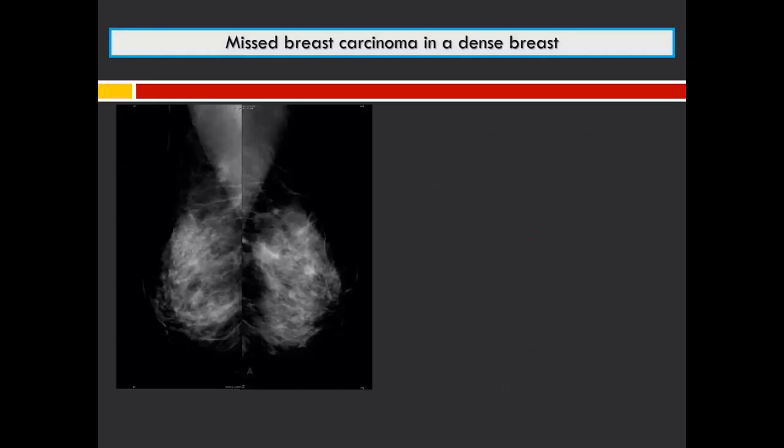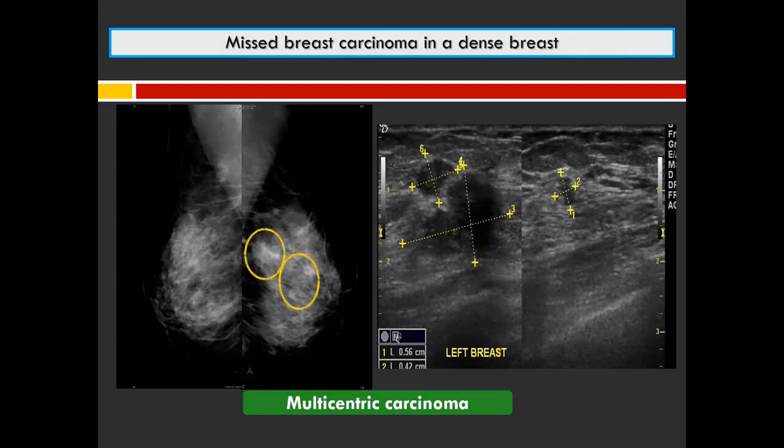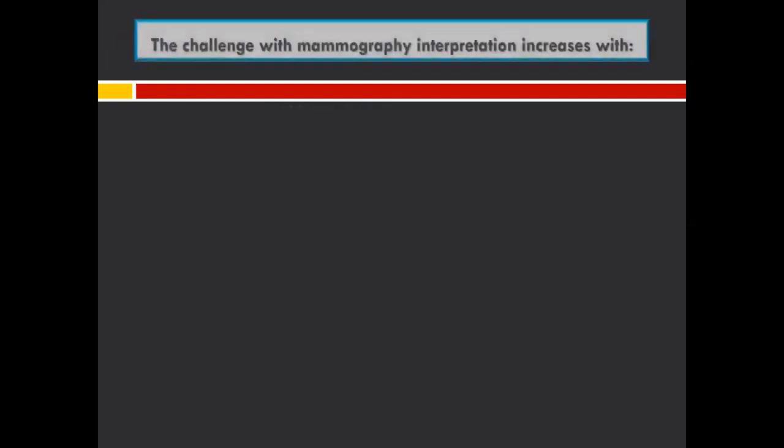And this is one applied example which shows us the real limitations of mammography. In this heterogeneous dense breast parenchyma, we can see nothing, although clearly on the ultrasound examination, we can see multiple variable sized hypoechoic lesions, which prove to be a multicentric carcinoma, and they can be hardly seen within the mammogram of the patient.